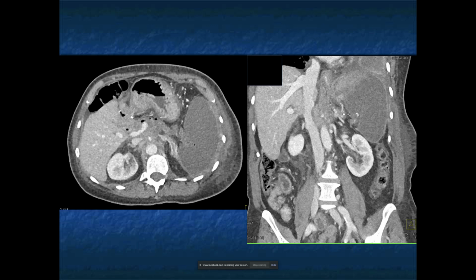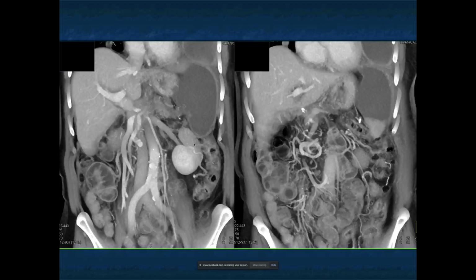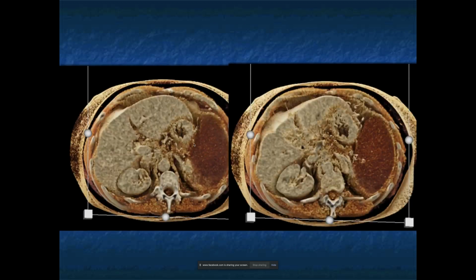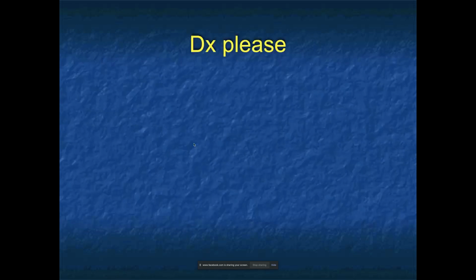That's a global appearance. Well, it's not an abscess, not the entire spleen. It's not sequestration, obviously. This is classic for a global splenic infarct or near global splenic infarct. There is some normal enhancing tissue in the lower portion of the spleen. Large spleen, low density, global infarcts, endocarditis, postoperative patient, particularly pancreas or anything that involves the splenic artery, perhaps. Beautiful global infarction. Here it is on the cinematic renderings. Red is low density, is fluid. Global infarction of the spleen. Just a really nice example.